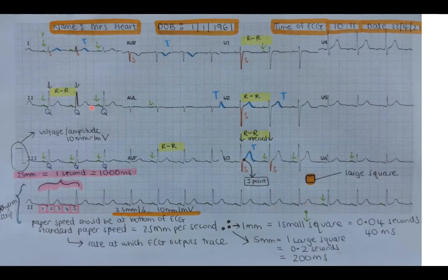Okay, and then finally your T wave, which is after your QRS complex, you get your T wave. And again, if you're struggling to find or visualize the T waves, you can plot in a lead where you can see it well, and then just go down. That's a T wave, that's a T wave.